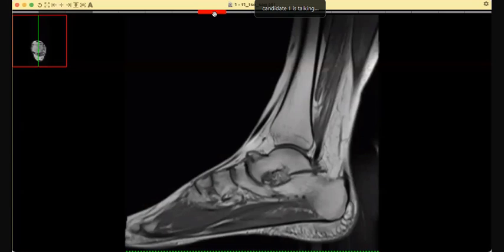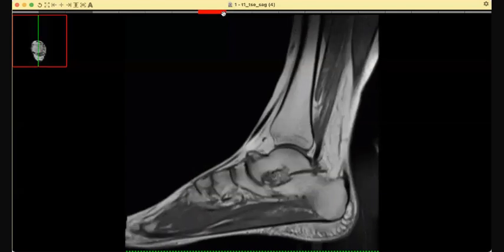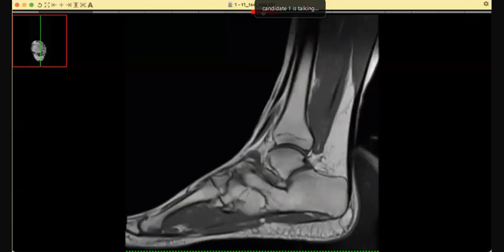I know of two. Remember, there's a talonavicular, and my question is slightly different. There is coalition between the two bones, and what can be the bridging material between two bones? Bone or cartilage. Right.